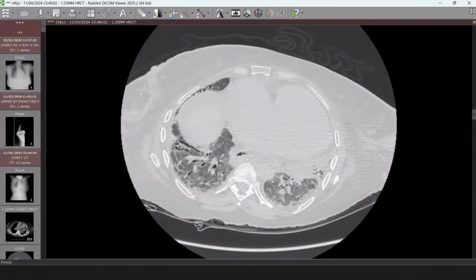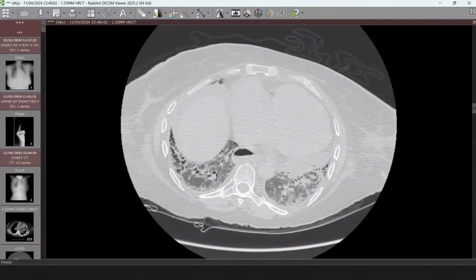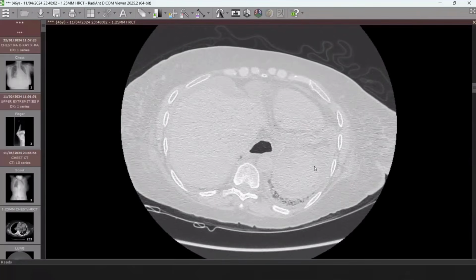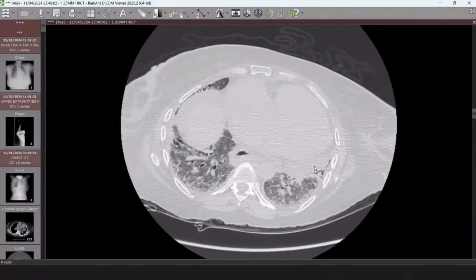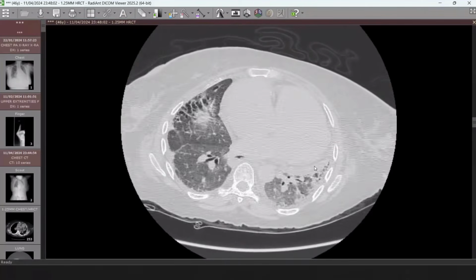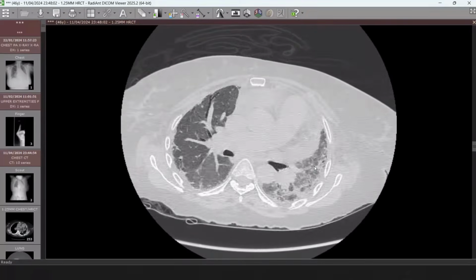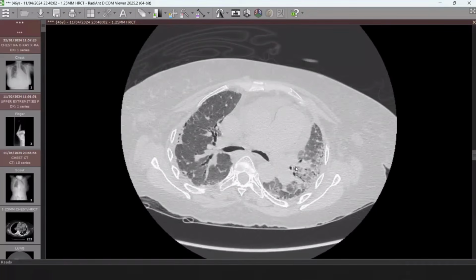So, in conclusion, give me the diagnosis. So in conclusion, as I can see, the dilated esophagus with a non-UIP pattern, because we can see traction bronchiectasis, but we can also see ground glass appearances. So NSIP and combined pattern with dilated esophagus. So this is scleroderma along with interstitial lung disease.